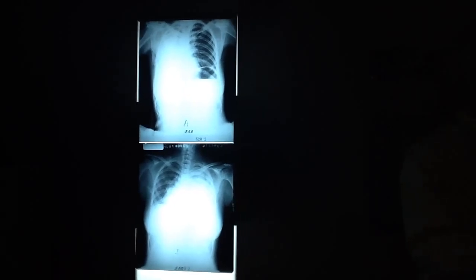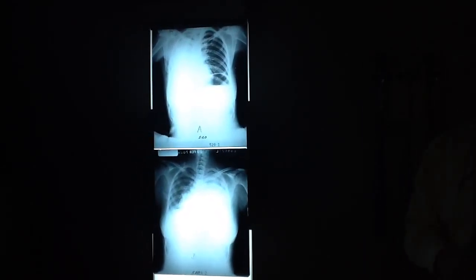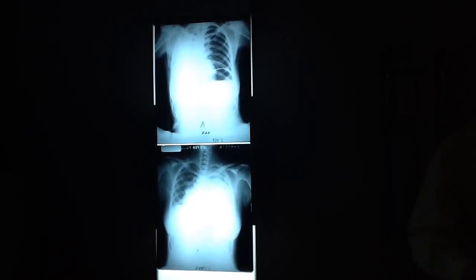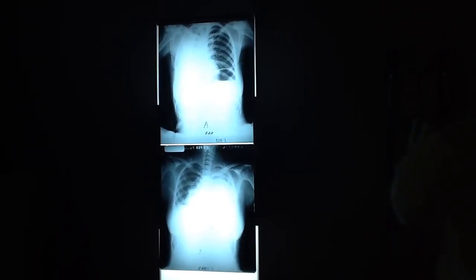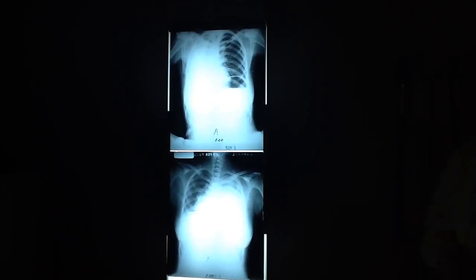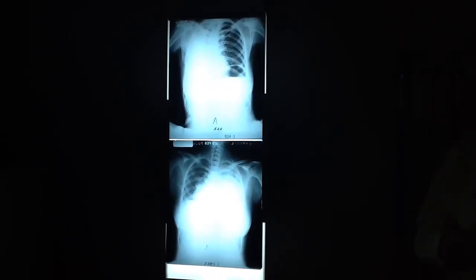With what? With mediastinum, chest wall, diaphragm. If we're silhouetting all those things, then it can't be on the external chest wall. It's gone. Easy. So then we're consolidation, atelectasis, tumor, pleural.